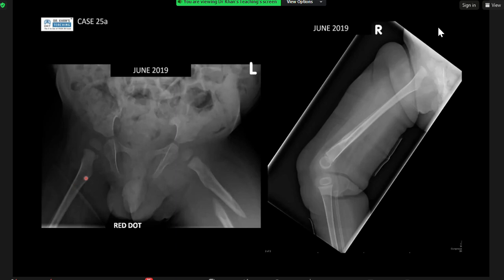I think the diaphysis is probably a bit projectional because he's not quite centered, it's a bit rotated. He has periosteal reaction on the right side, and it's confirmed on the long leg views. On the left side, it's probably a more chronic fracture with periosteal reaction and signs of healing. It's displaced and quite separate, which is why it's probably trying to heal but cannot heal. You can see all that soft tissue edema and swelling because of the density of the soft tissues. So something's going wrong here.